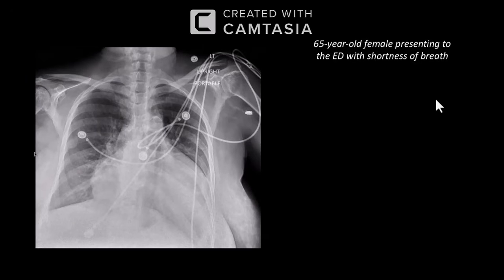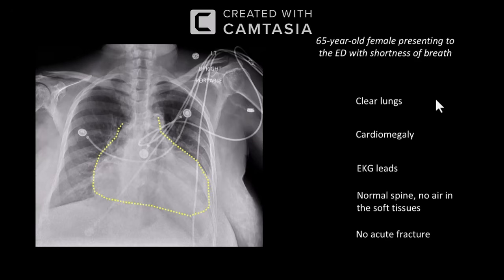Okay, good. I think you have summarized very well. What you see here is that the cardiac margins, or the heart shadow, are quite enlarged. And yes, I can agree with you. There is slight blunting, on the left side. Definitely, there is some sort of blunting.